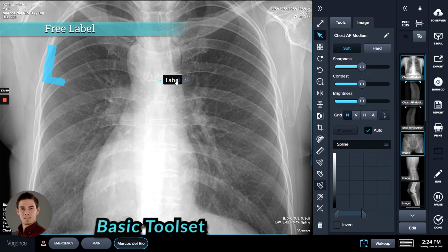Edit that by double clicking into it, then double clicking again to select the entire word, and then just begin typing. And click away to get out of the label itself. So the little box over here you can use to manipulate the size. The tool to the left is going to be utilized to rotate the label. So we're back to default selection mode, select each tool, and hit delete to get rid of it.